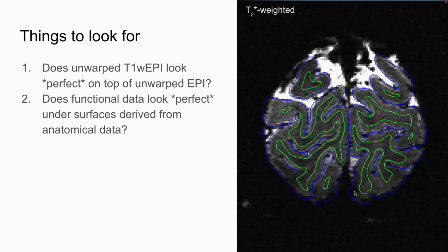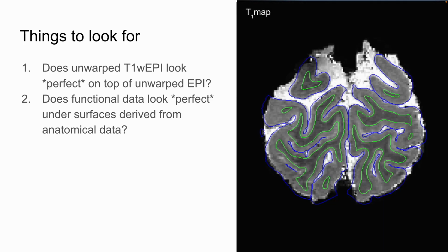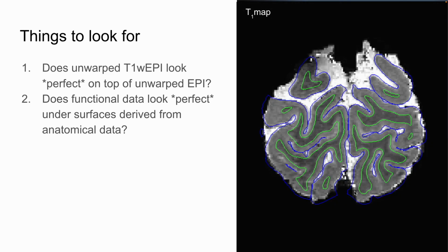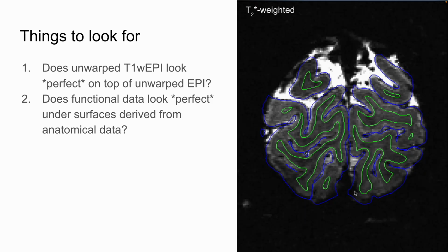How do you automatically detect those places and leave them out? I don't know. So then here's me flopping back and forth. And here there's a slight shift between the two images because I failed to align them in the Google slideshow, not because there's an actual shift between the two, because you can see those blue lines moving.